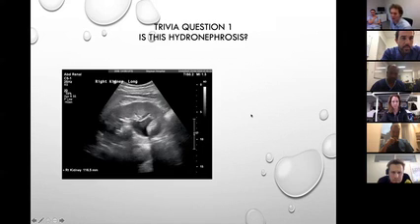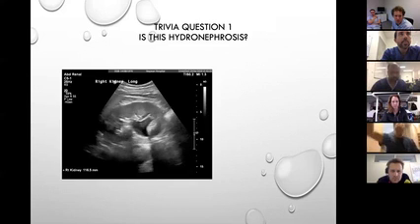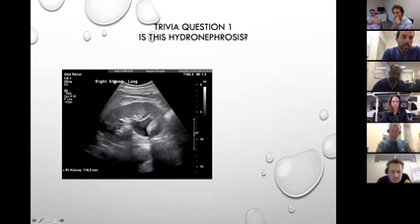I'll have a crack at this. I'll kick off, Vijay. Yeah. So it's normal size because it's within that 9-11 centimeter area. Yep. Is the measurement that you'd want around the calyces or at the actual pelvis junction? Just where your arrow is there. Can you measure the pelvis? Can that help you to grade it? It definitely would only be mild. If there was hydronephrosis, you'd say it was normal or mild.